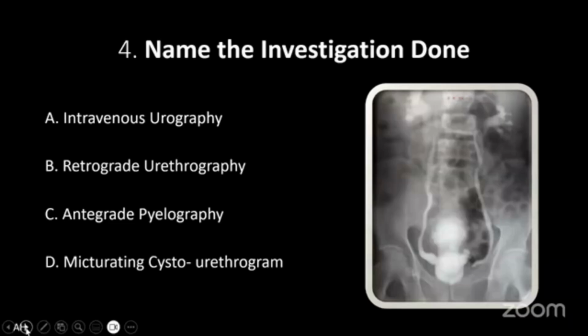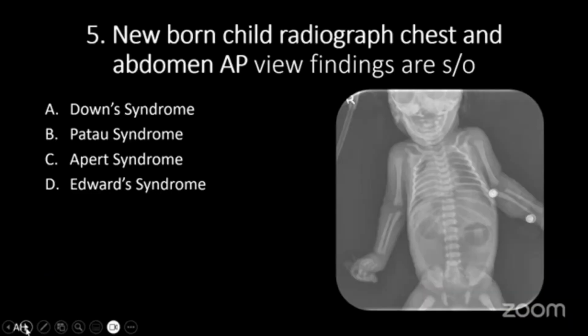Here you can see typical MCU showing pear-shaped diverticulated bladder with severe bilateral VUR, which is very classical. There is no nephrogram if you thought about IVU. That situs inversus also having reverse double bubble appearance with 11 ribs. Very classical about Down syndrome.